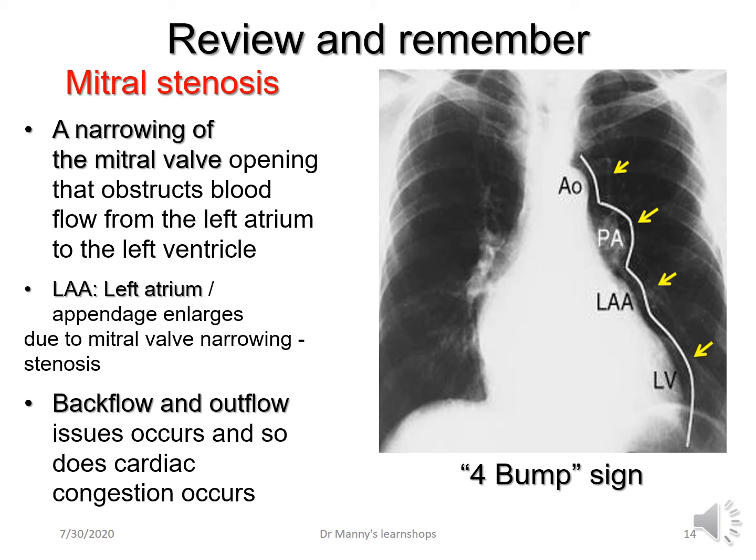It's the LAA, or the left atrial appendage, that enlarges due to the mitral valve narrowing or stenosis. As a consequence, there could be backflow and outflow issues, so cardiac congestion occurs.